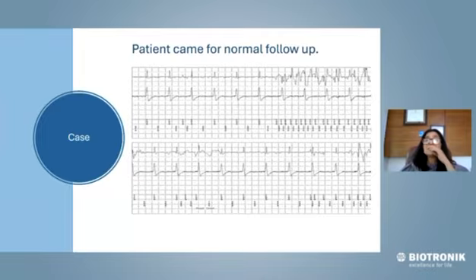Sensing, we told you, has to be very good. So this is another case. Patient came for a follow-up. What do you see here? Whenever somebody gives you this EGM, you have to look and identify what is happening on this EGM.